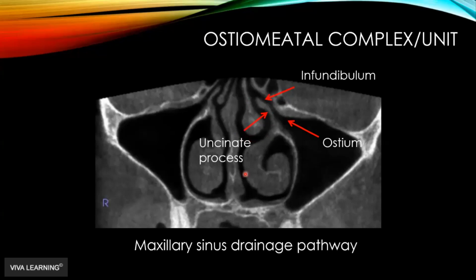So look at this patient. We've got a little bit deviated septum here, turbinates fairly equal bilaterally, but look how diminutive this right middle turbinate is compared to the left. So when you think about the ostium, it's not exactly taking advantage of gravity. So how do we drain through an ostium that's in a superior position?